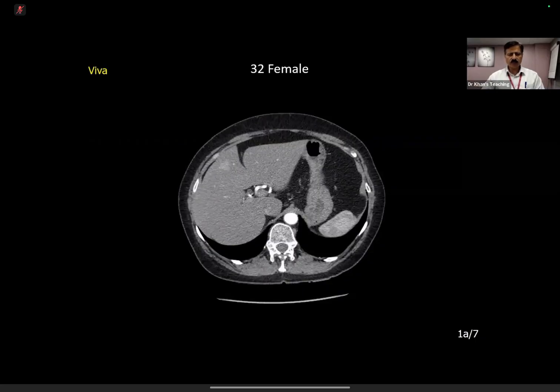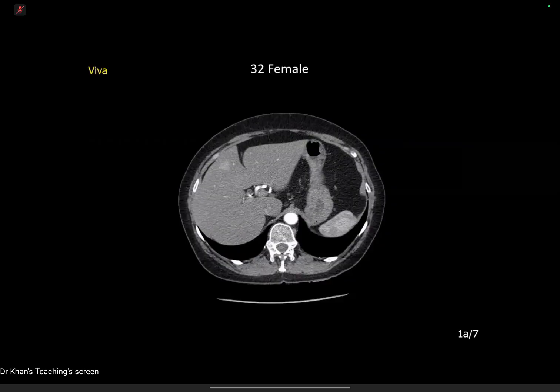So the examiner has opened the software, and this is the image. I've got axial slices of the upper abdomen, a post-contrast scan, and I can see in the right lobe, just lateral to the falciform ligament, a hyper-attenuating, somewhat circumscribed lesion. It's a solitary lesion on this single slice, and the rest of the imaged abdomen appears unremarkable.